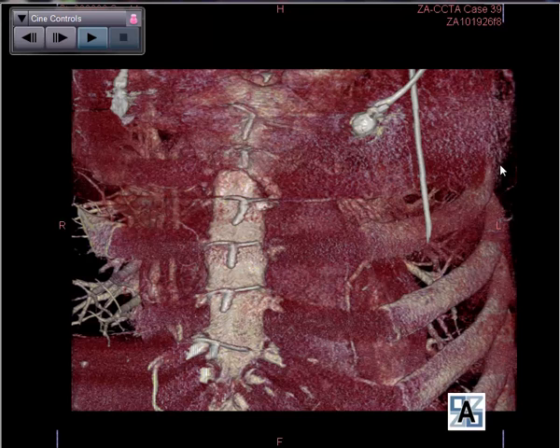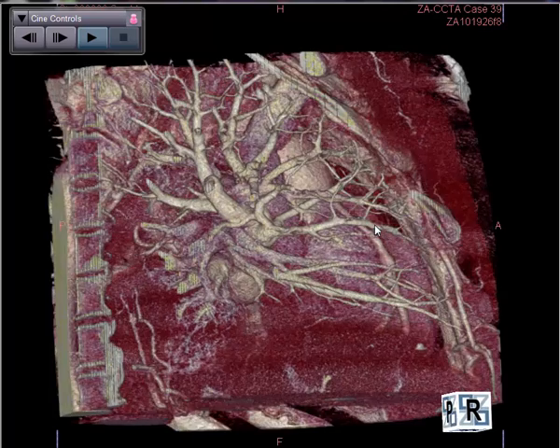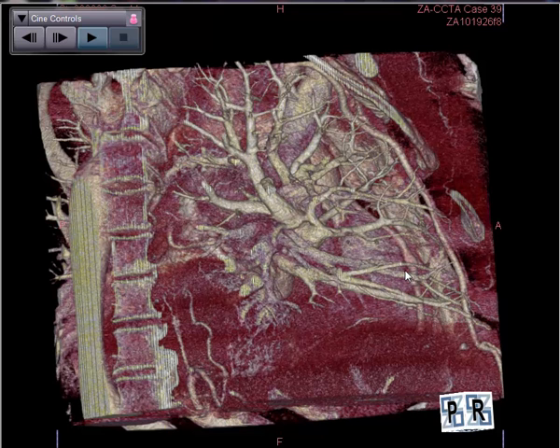Here is the three-dimensional area. We want to look specifically at the sternum to see that this is fully intact. We can then switch to a right lateral by switching to the R view and get an idea that we can see the intact and large right internal mammary artery in its usual place on the chest wall. I can't see any left internal mammary, but we're going to have to get a little bit further into the evaluation.